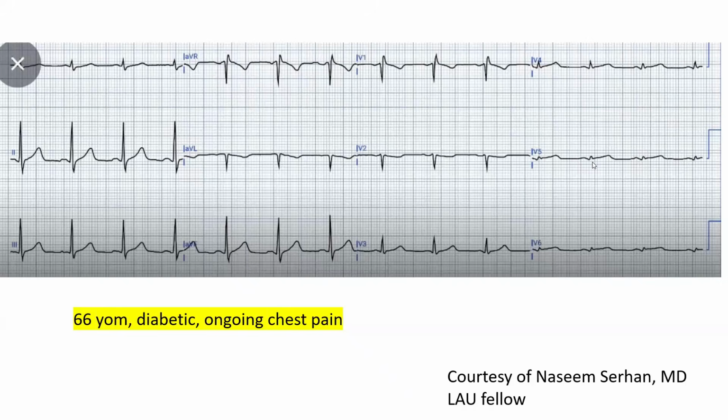Also, you may have an ST elevation that is mild in absolute terms, but it is concerning when it is over 50% of the size of a tiny shrinking QRS. This is not published in those exact proportions, but that fits with the standard STEMI EKG progression. There are more subtle features on that EKG.